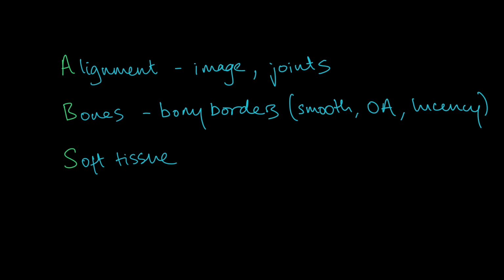They can also be suggestive of smaller fractures, which don't have obvious fracture lines visible in the bone on the plain film. The last bit that we have here is the soft tissue component. The first thing that will be quite important in this will be to look at the swellings that you'll see. Specifically for the pelvic and lower limb x-rays, quite often you will be using these to assess joint pains or pains in the bones, especially following trauma, and hence the soft tissue swellings can be very helpful in directing where you might expect to see the pathology that you're looking at. Beyond that, other things that you'll encounter will be things such as fat pads, and sometimes you might see areas of bleeding.